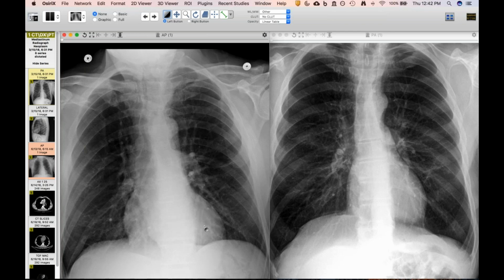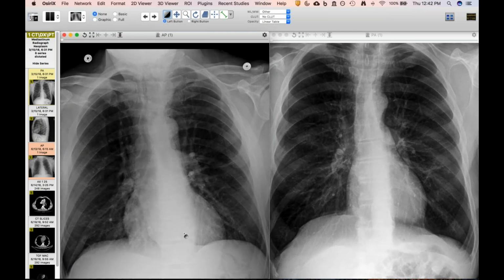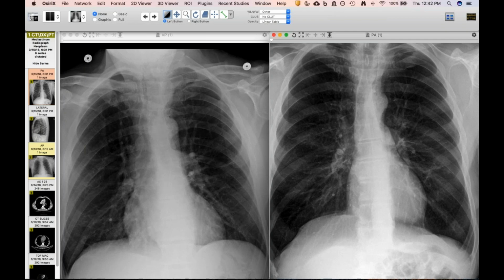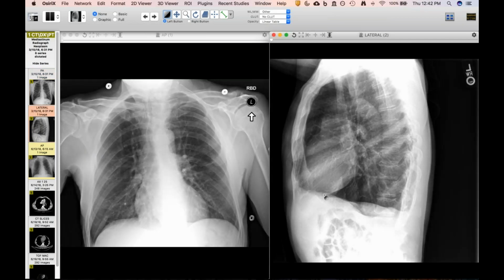And in this case, the left side looks okay, but I noticed on this radiograph, I wasn't really happy with what we were seeing here. And this is a patient who had no prior cross-sectional imaging to compare to. And I wondered, sometimes we see varices back here or hiatal hernia. Certainly he didn't have a hiatal hernia on this prior lateral radiograph, and it looked pretty good there.